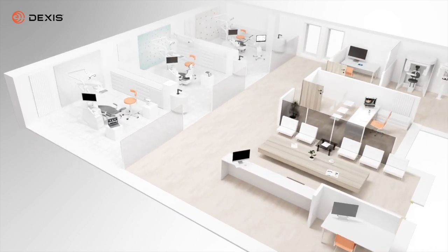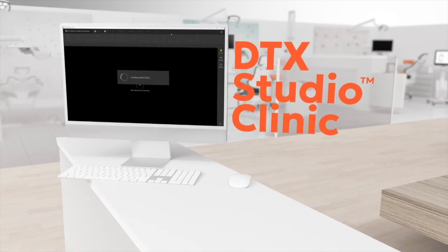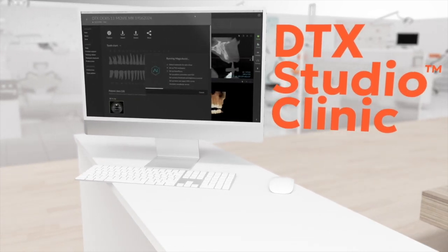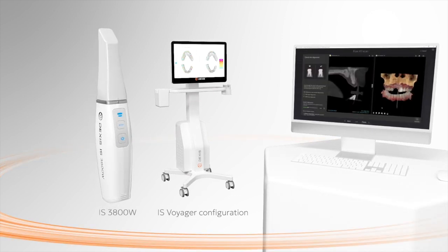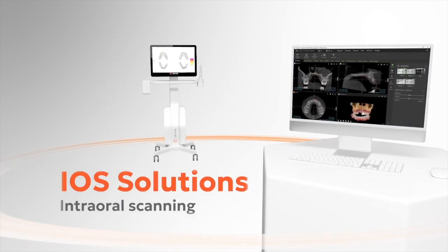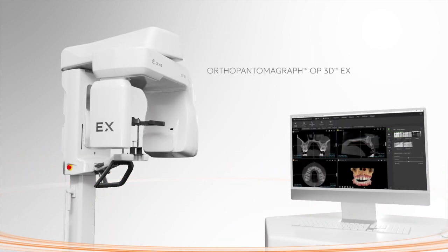In the fast-paced world of dental care, staying ahead means embracing technology. Experience the pinnacle of efficiency with AI. Gain greater clarity into patient anatomy for precise diagnoses and simplify your case setups with automation. Combining CBCT, intraoral scanning, diagnostics, and treatment planning, the DEXIS digital ecosystem is your interconnected AI-powered platform for digital implants.